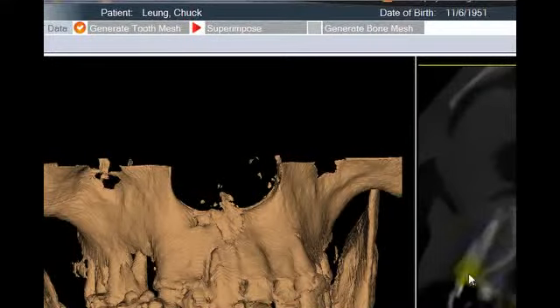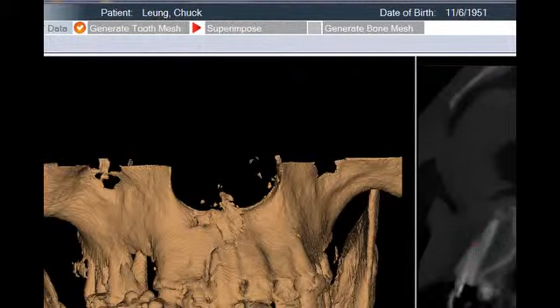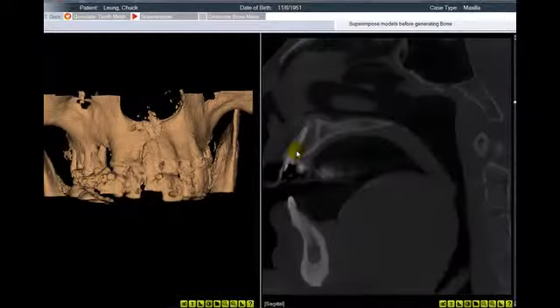Anyway, we are interested in the area of tooth number 8 right here. So we can see that this tooth has a root canal right in here, and it has a post, and then of course the very thin buccal plate. So you're going to be extremely careful when you extract this tooth, so we can place the implant a little bit more palatally in here, and we can achieve good initial stability as long as we get 50% of that implant into the bone.